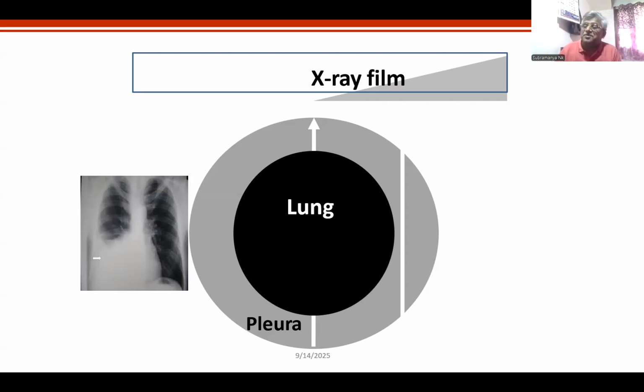It is a myth. You read Felson's textbook. I was delighted to know that. Now I will go back to this X-ray. Can you see this lateral ascent? Whatever you are seeing is because of this explanation. Please type L if you liked and understood. That means to say tangential X-rays pass through more fluid, whereas in the middle, they pass through less fluid.